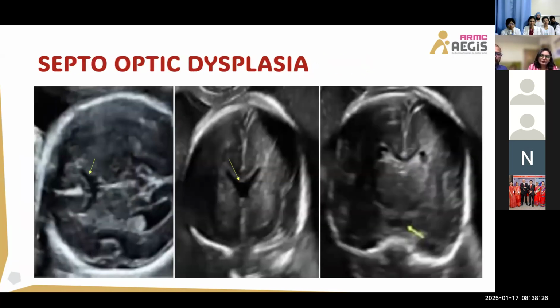Yeah. Can you go back to the previous slide? Okay, so again they have the thalami, LS, and here you should have got a gray tissue like this, but they didn't get, isn't it? Yes. Yes. Okay, so we need to confirm it in two planes. So this is the expected image in an abnormal case. All right, thank you.